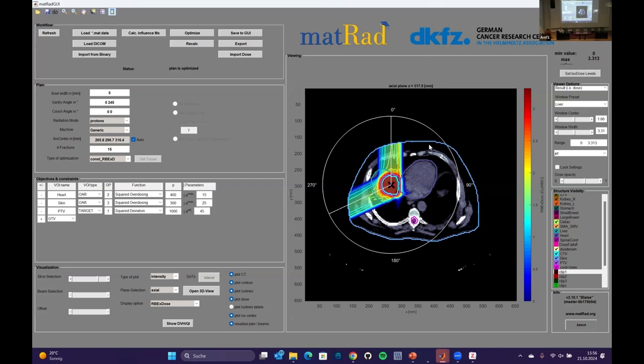And then I come with a little bit of a running nose to the treatment. Nasal cavities are filled. There is now liquid inside and weird stuff, and this actually has a water equivalent depth. So this is not air, so the proton spot will probably stop earlier now.